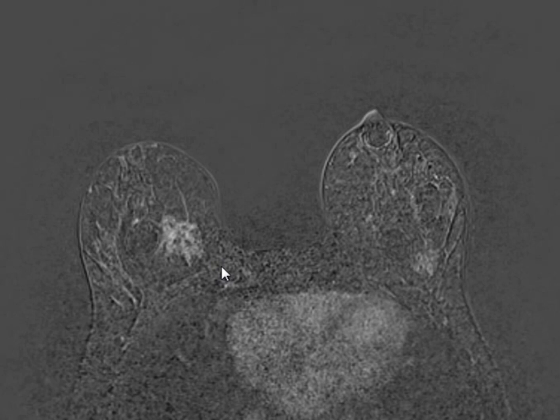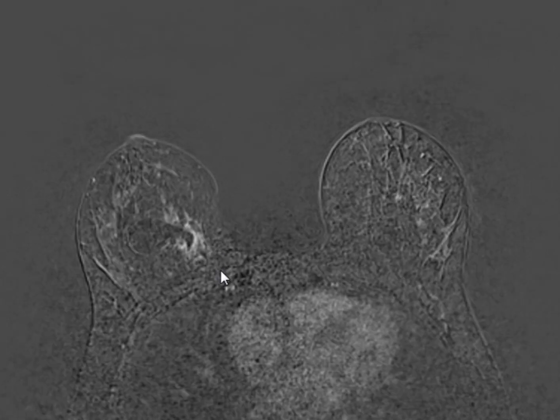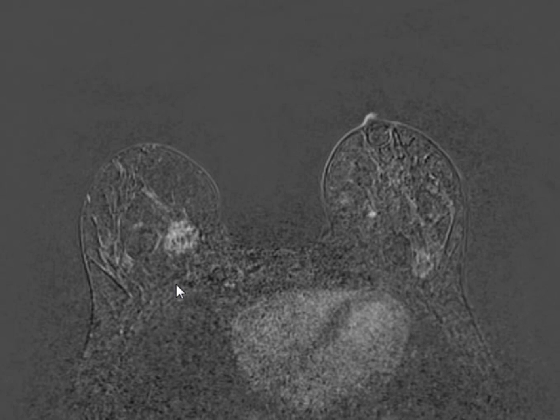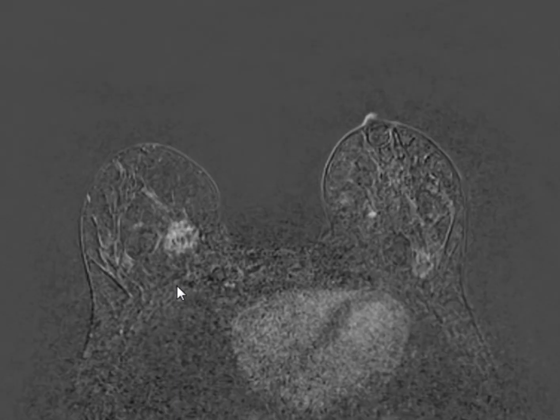When we started, I told you this is a 38-year-old patient. So she is hormonally active, with menstrual periods and pregnancy and delivery. She's not menopausal. So this pattern of post-contrast enhancement is normal or abnormal? It's a normal pattern of post-contrast enhancement. It's patchy parenchymal glandular enhancement. The glands of the breasts show this patchy, non-mass-like pattern. However, the masses that we saw, the cysts, show absolutely no post-contrast enhancement.